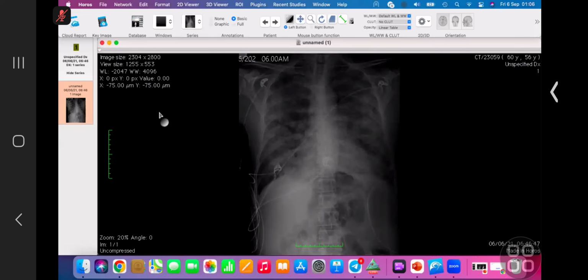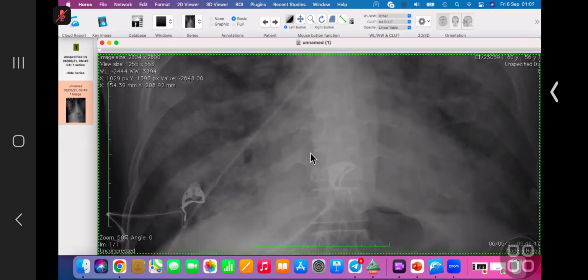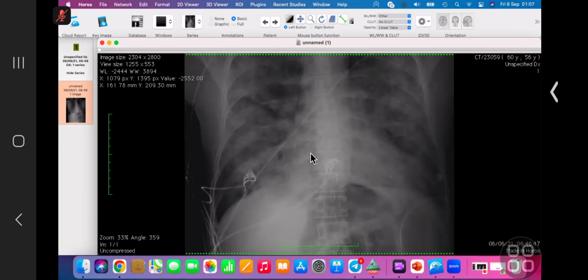Okay, so I'm presented with a frontal chest X-ray, or is it a scanogram, of a skeletally mature patient. I can see multiple lines overlying the chest, so the patient is likely acutely ill.